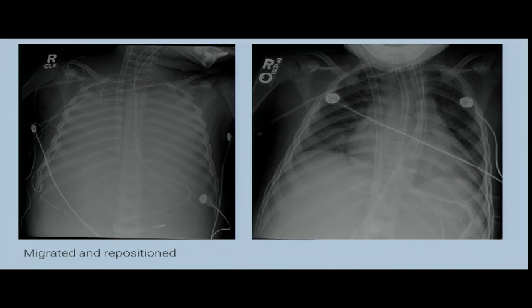And this is the same patient. After the cannula was placed, there was migration of the cannula superiorly, and this is where the side hole is. So this is a bit high, and this was an attempt at replacement or repositioning of the cannula. It was moved down. Not really where it ought to be, but a bit better than what it was.